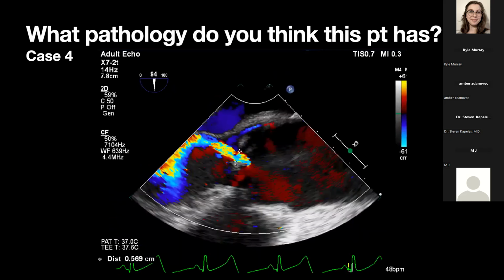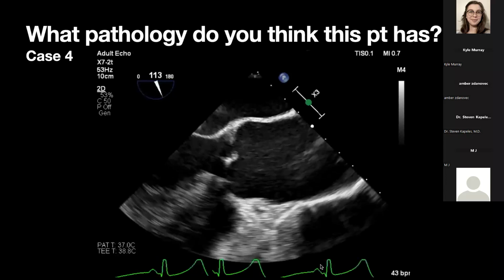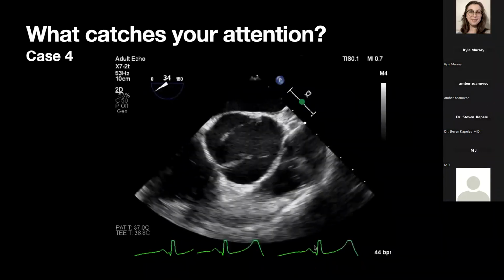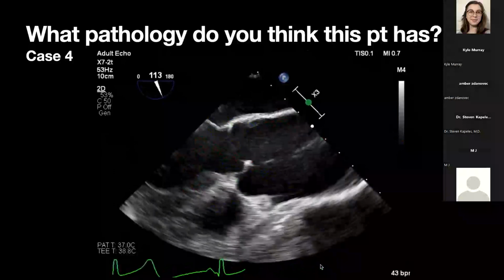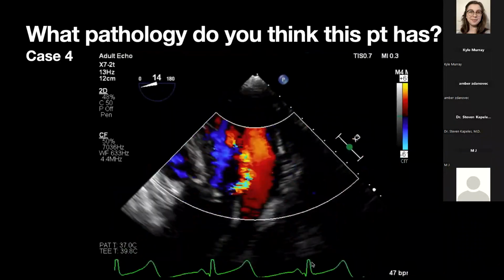Aha. Yeah. So the root was huge, right? So you're going in there anyways. And then what kind of valve, if you remember, did we say we thought this was? Yeah. So it's not all about the severity of the regurgitation, because there's other things. So sometimes we get to squeak out and we don't have to call it severe just to have it be replaced.